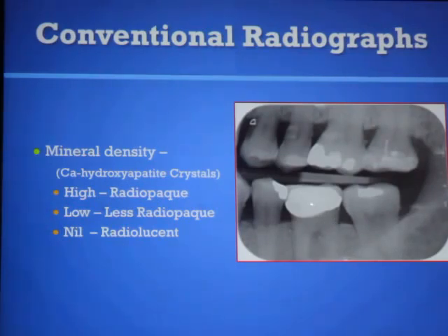As we see, that's very high density, and we can separate it out from the gingival tissue that generally sits here because there is a contrast between two objects that helps us to identify enamel, amalgam, composite, bone, dentine, pulp, all can be separately identified because they are next to each other, creating a sufficient contrast for us to recognize them on the radiograph.